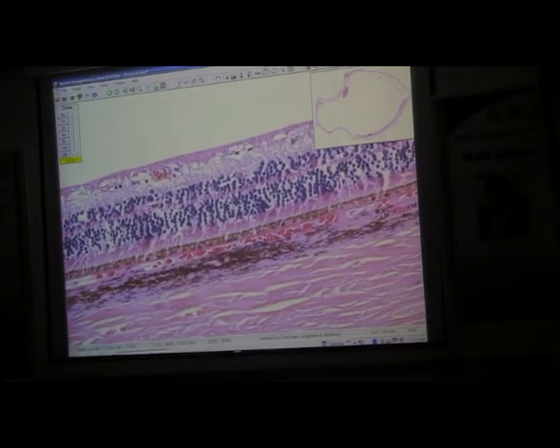and now we have a problem. Here I have the pigment epithelium, the outer nuclear layer, the inner nuclear layer, the inner plexiform layer. Where are the ganglion cells? So you said to me, well, Bob, you have a cell here and a cell there. Look, ganglion cells are supposed to be huge. These things look like, in Yiddish, a pintula, a little dot. Okay, it's not a ganglion cell.